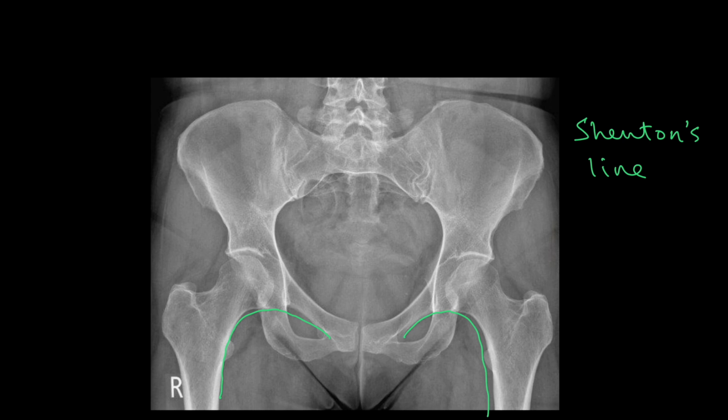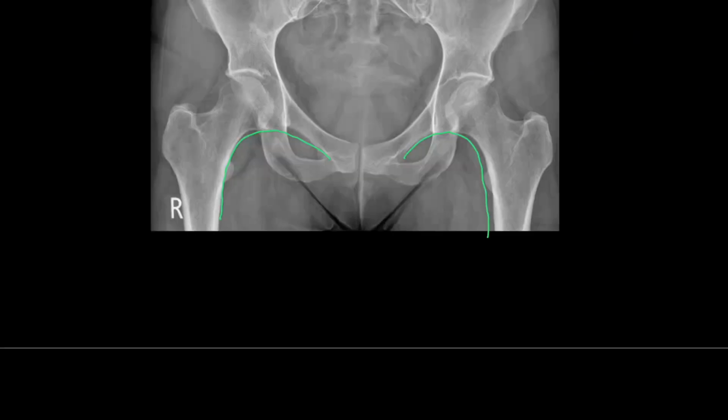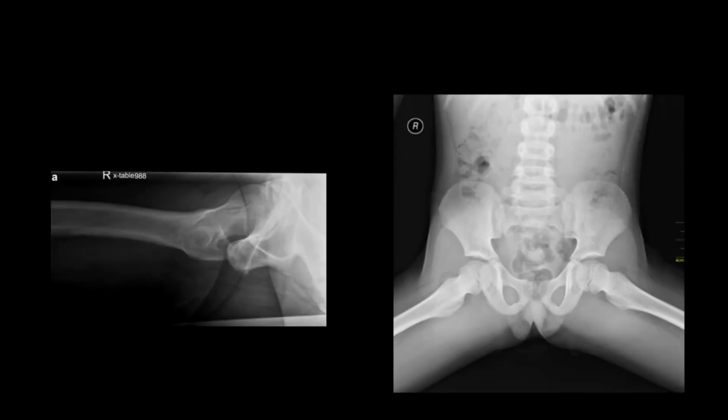Moving on, we then want to check our S component. So again, if there are any changes in the soft tissue spaces or any of the joint prostheses. Again, talking about the concept of orthogonal views, we will additionally do a lateral view when we're taking these. You'll find quite often in clinical practice, it can be harder to see all the bones as clearly as we have over here. But what they will be useful for is if we can, again, trace the borders of the femur as we can over here. And again, giving us a second view from a different angle can give us a better idea of how displaced a fracture or a dislocation might be that won't have been so clear from the first x-ray.